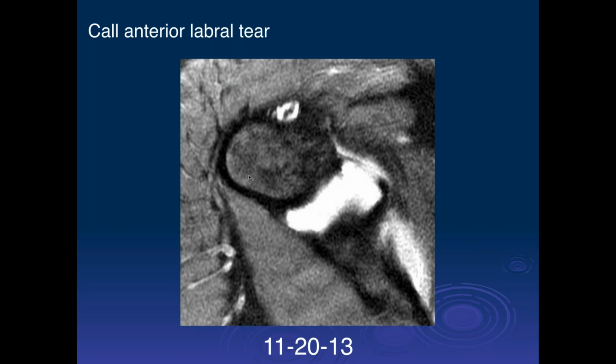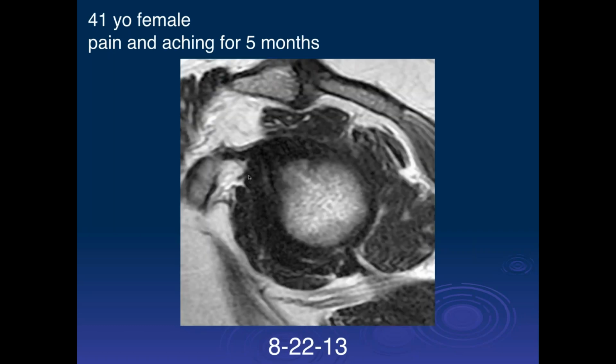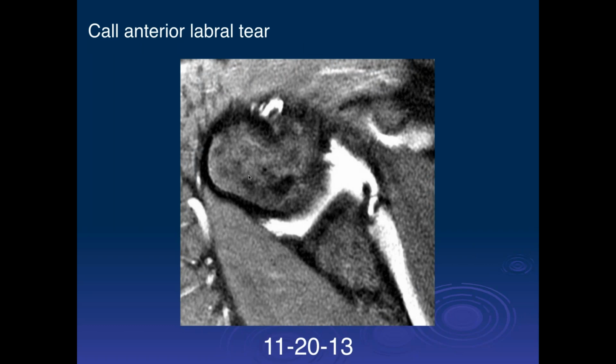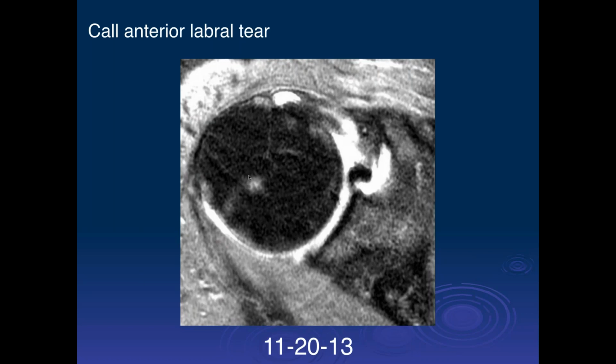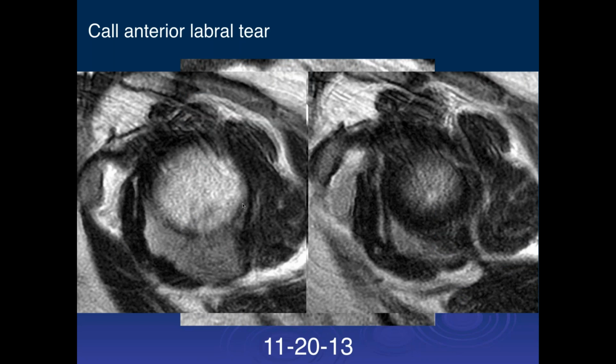Okay, now the patient came back about 3 months later, and this is what it looks like. This is now an arthrogram inferiorly. If we come up a little bit higher, and higher, and then we come back up to that little cystic lesion here. So what do you think's happening here? I think that there was... Fell off a horse. Here are the sagittals.